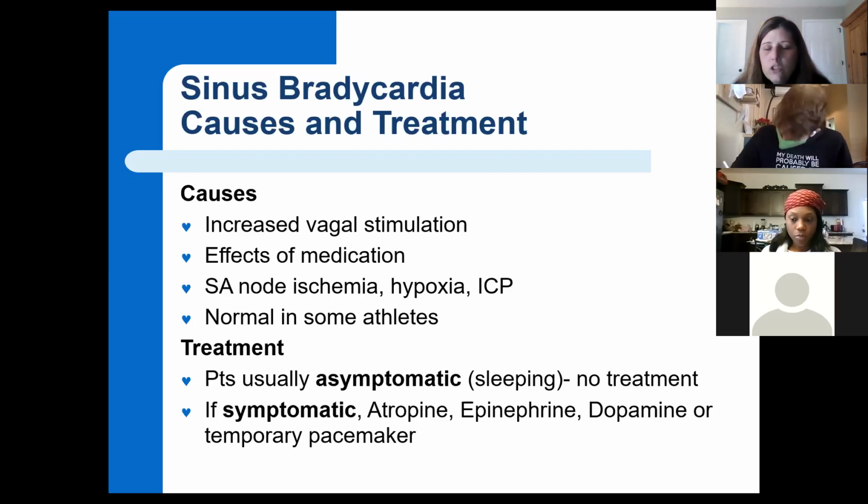So we might give you a strip, for example, on a test, and it might be sinus bradycardia. And we might tell you that the patient has such and such a symptom. What are you going to do? Or we might say your patient is asymptomatic. When you went to check on them after seeing this on the monitor, you found them asleep in the bed, resting comfortably. What are you going to do? Well, you're going to continue to monitor. If they're asymptomatic, you typically continue to monitor, okay?